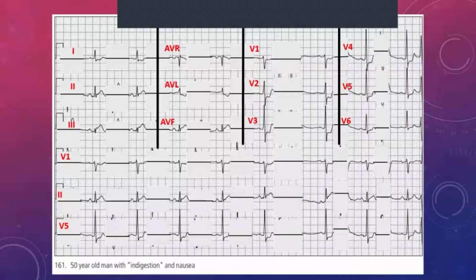So when the atrium is functioning, when the P wave is present and stimulating the ventricle, we are getting a bradycardia. So it's only doing it 50 times per minute. So something is going on. Something is giving us a bradycardia. So let's have a look at the next part. And let's just revise what we found already. So we found we've got a normal axis, we've got a sinus rhythm, but that sinus rhythm is a bradycardia.